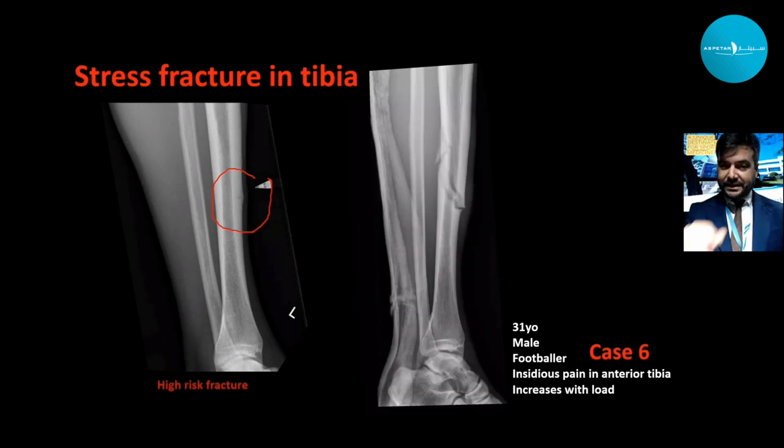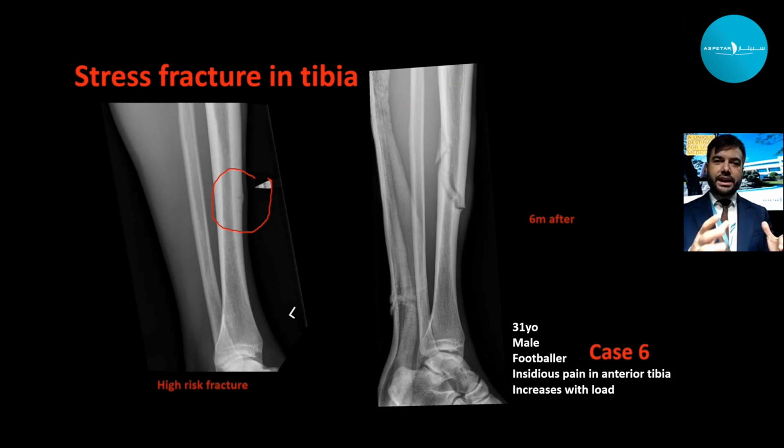This is 6 months after. This patient apparently didn't stop playing. He didn't recover well eventually. As you can see here, this is the original incomplete fracture. Now there is a complete fracture of all the tibia.